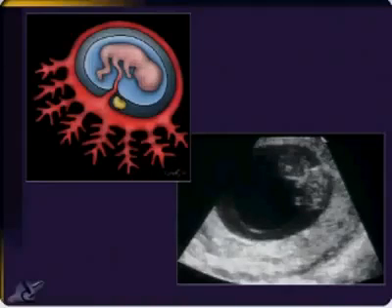The other thing I want to point out is when we look at this, look how clear the fluid is in the amniotic cavity, and the chorionic cavity, which is getting smaller and smaller, is now becoming echogenic. That chorionic cavity is filled with proteins and mucopolysaccharides that are actually quite sticky. And this is the reason we do not do amniocentesis in the first trimester.